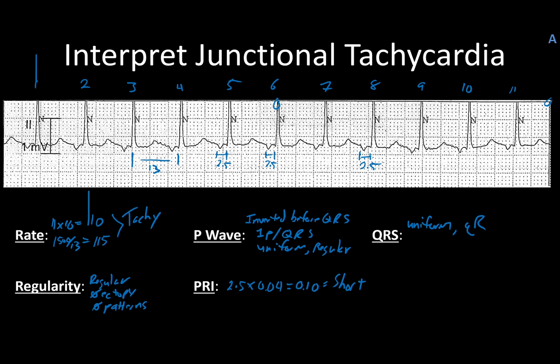And so now we just need to get these measured out. This may be a little bit tricky. You'll notice how the QRS slopes out a little bit towards the end. So it does make it a bit challenging sometimes, but we'll just go with the ones that looked the cleanest. And so this one here, beat number 10, it's pretty clean, and we'll say that that's, gosh, between 1.5 and 2. We'll just call it 2. And if we look at some other ones here that might be a little easier to read, this one's right here. Yeah, right between 1.5 and 2. We'll round up. It really doesn't matter in this case.